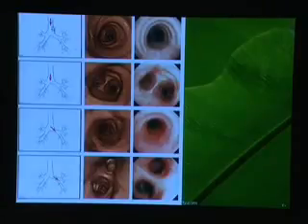This is how the endoscopic anatomy looks. We have a different appreciation than on the axial CT, like when you are directed downwards, you are going to the carina, below the level of the carina, then you are directed towards the right main bronchus. Coming to the right main bronchus, what's anterior is upper lobe, what's posterior is bronchus intermedius, and so on. The appearance of each bronchus end-on is rounded or triangular or elliptical. You have to appreciate the anatomy this way. It's slightly different than the axial anatomy.